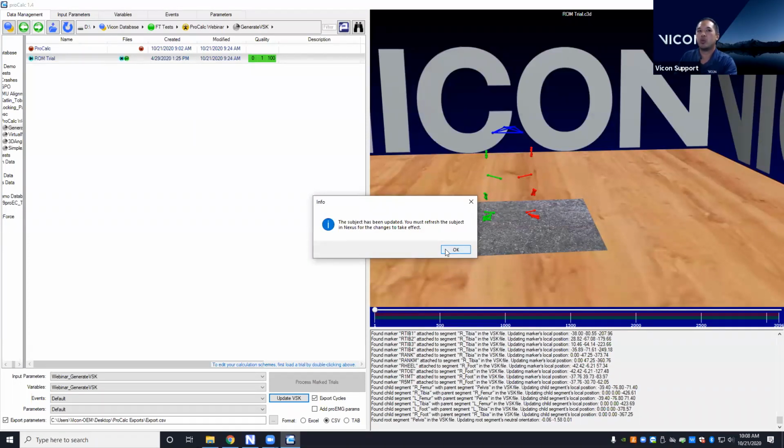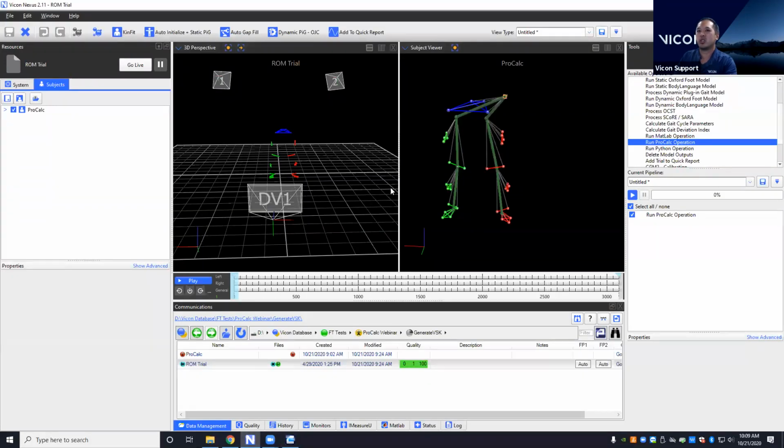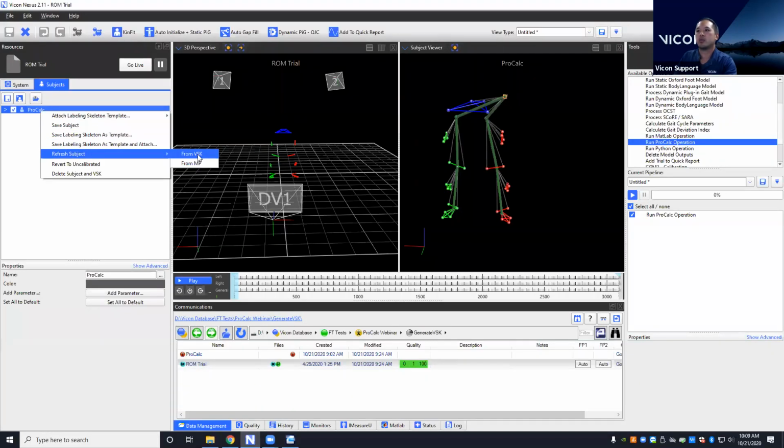I do have a video on our ProCalc YouTube playlist that talks about this a bit more in depth, so please view that in the future. I'll click OK and come back into Nexus. We don't see anything change because, as I said, it prompted you to refresh your subject. So I'm going to right click and refresh subject from VSK.